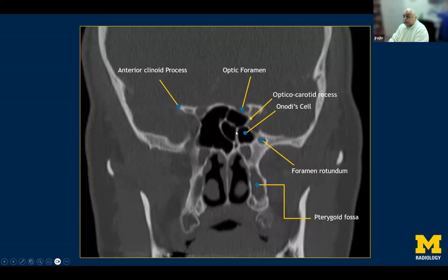So when you are approaching the sphenoid sinus, you're going to approach the sphenoid sinus anteriorly. So you need to go back and see what the mucosa is actually showing by way of looking at the bony profile previous to the positioning of your sphenoidotomy.